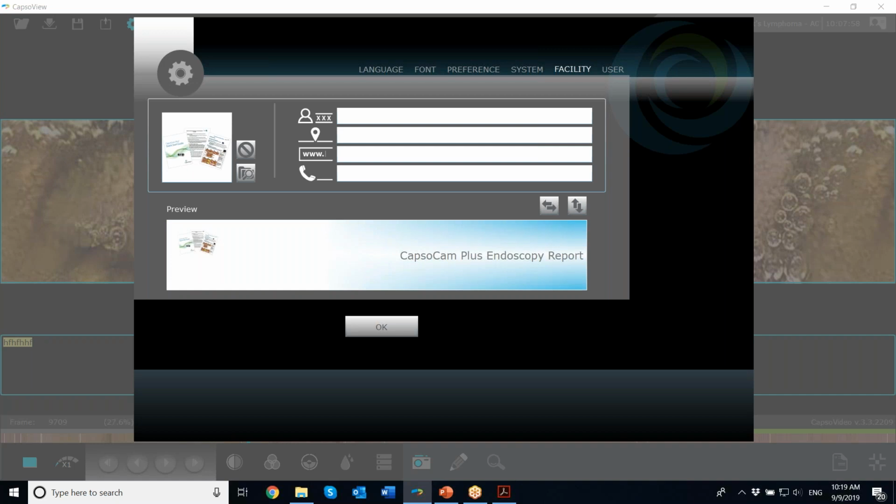Okay, so that was how to upload the logo, how to set up a report letterhead. So you can say Dr. A. You can say its address, 3 street, etc. You can do the website. And the phone number.